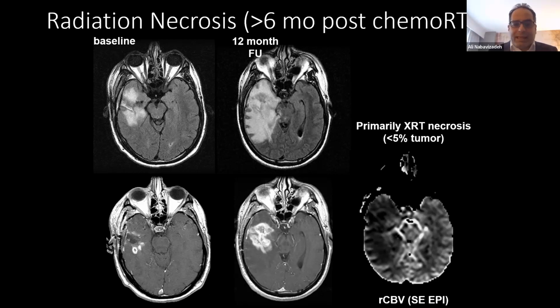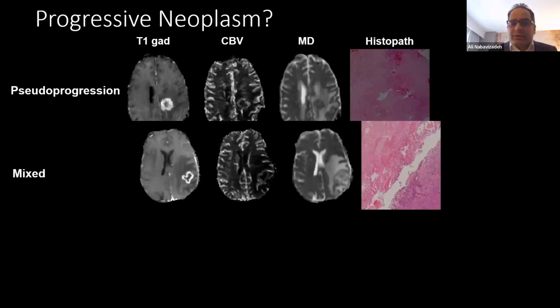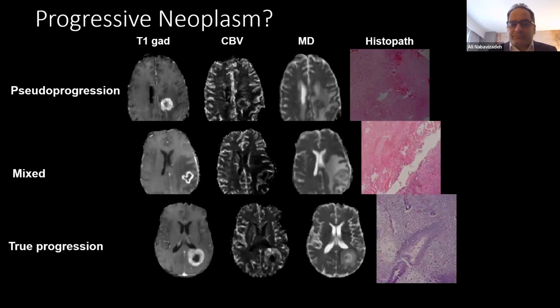If you look at the cases of pseudoprogression, mixed, and true progression, you can see that the contrast-enhanced T1 could be very similar.